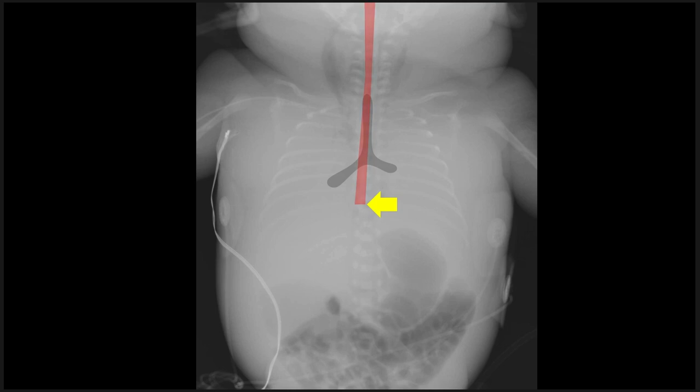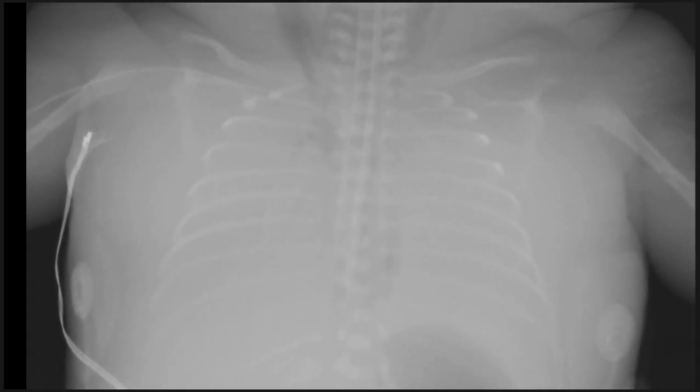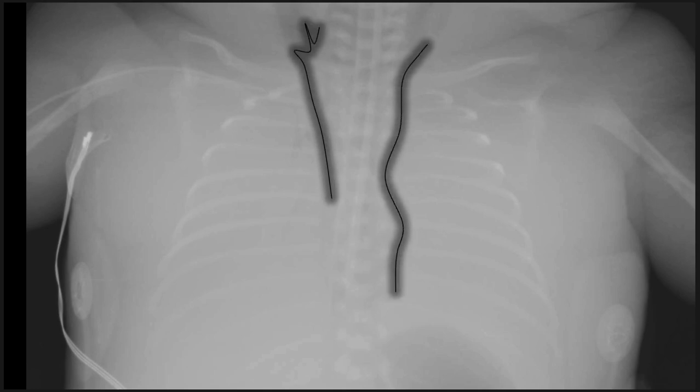That's not good. So let's take a close-up here, zoom way up, and I'm going to just trace this black stuff. Remember, gas is going to be that dark density there on a background of white stuff, and as you can see, it actually extends from the mediastinum into the soft tissues of the neck. So this is a case of pneumomediastinum from a ruptured trachea, unfortunately iatrogenic from an endotracheal tube.